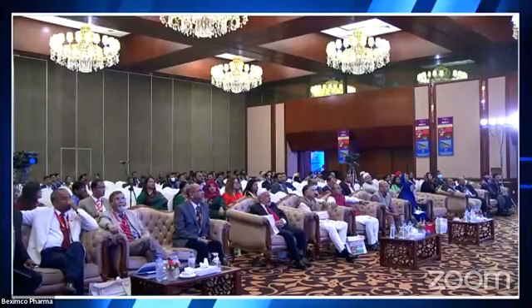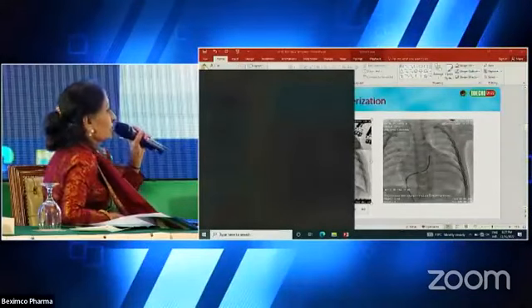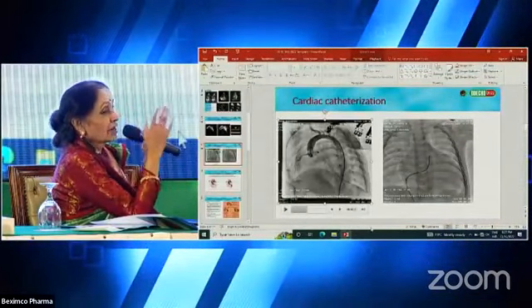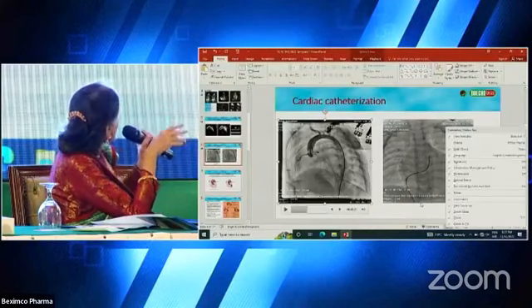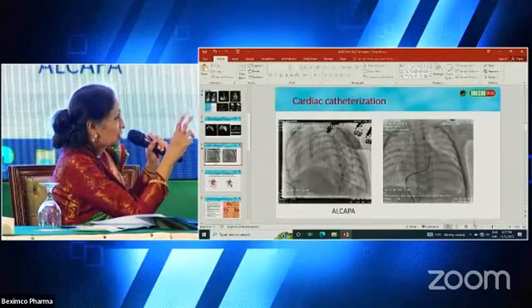Okay, that clinches the diagnosis. So what was the clue that you got in the echo? You did not mention it, that's the reason I'm asking. What was the clue that you got in the echo? Next slide. There was a glistening endocardium and hyperechogenic papillary muscle.